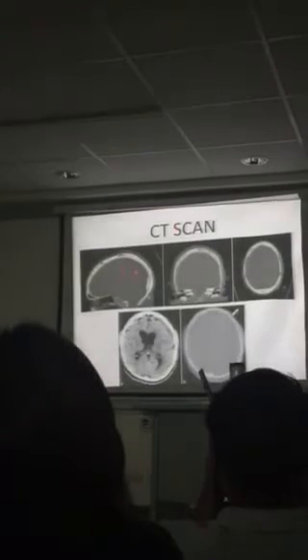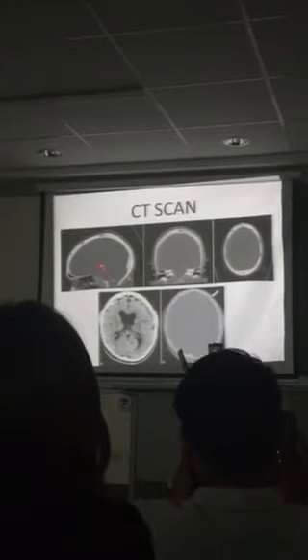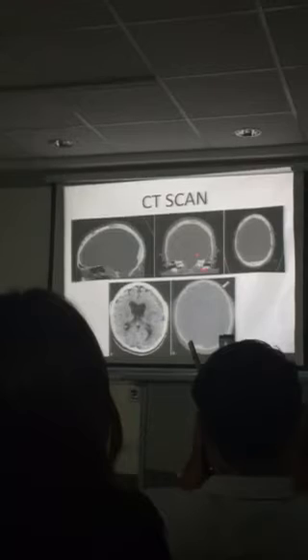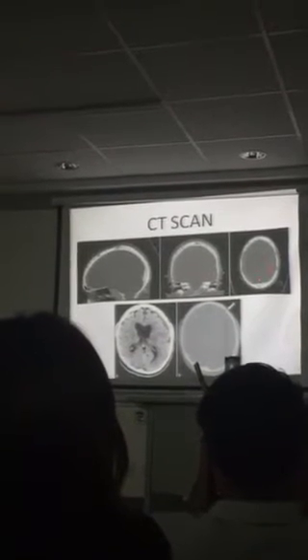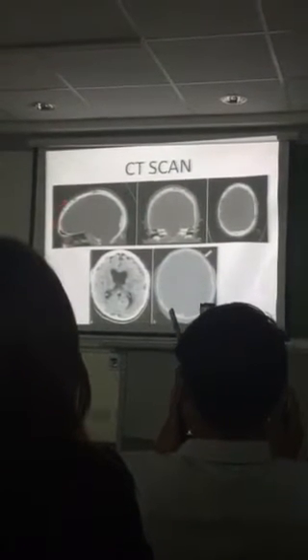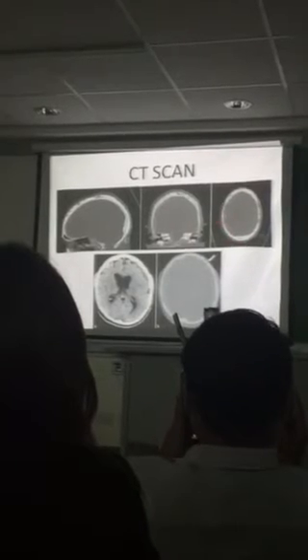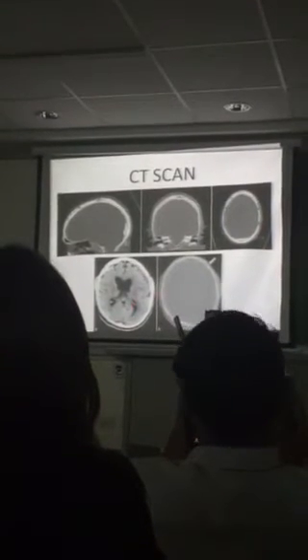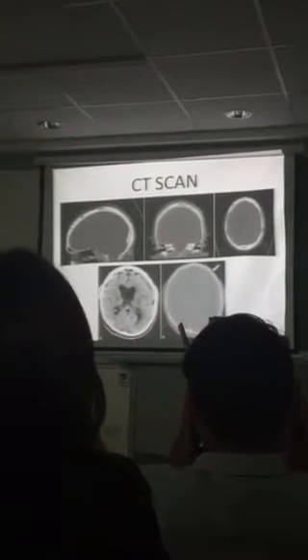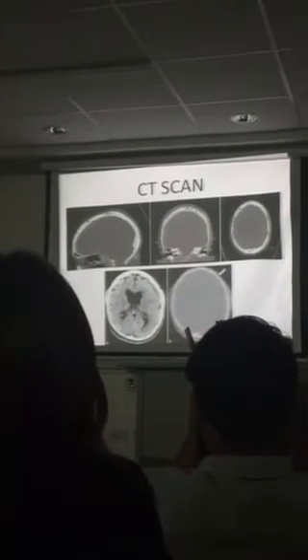What view is this? Sagittal. If lateral, sagittal. And then this one? Coronal. Axial. Remember, this is the right side. And this is the anterior part, posterior part, right, left. I can also have you identify which one is the brain window or the bone window. So this is brain and then bone.